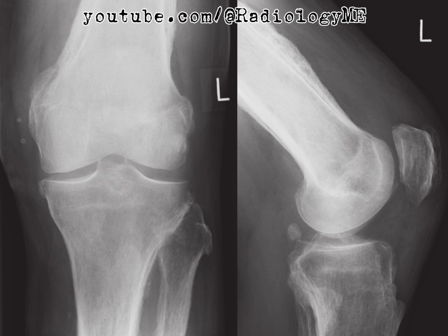Differential diagnoses to consider here would include hypervitaminosis A, which can cause a similar appearance, and pachydermoperiostosis, although the latter typically involves the epiphyses. Given the sparing of the epiphyses, these differentials seem less likely in this case.